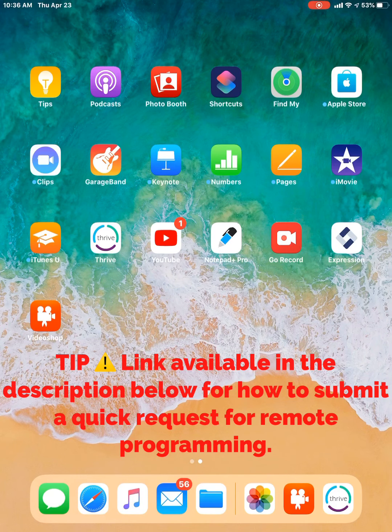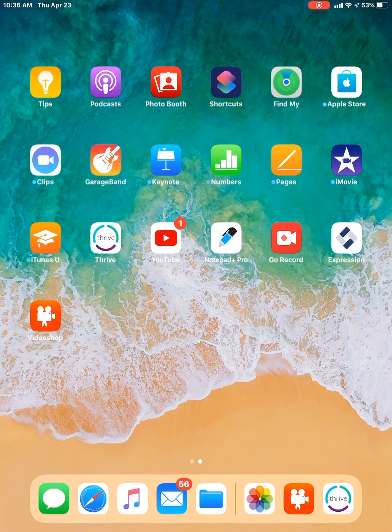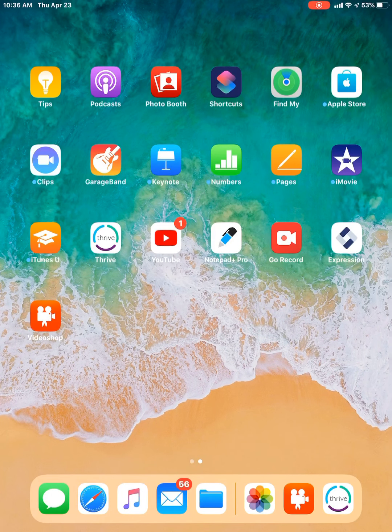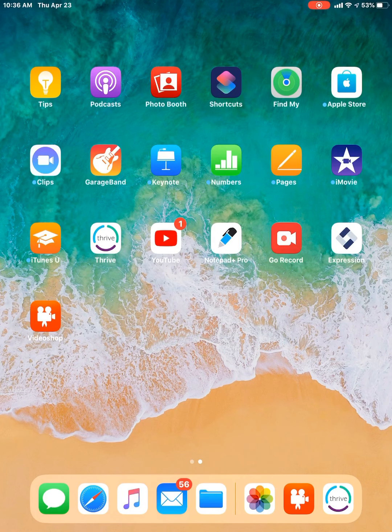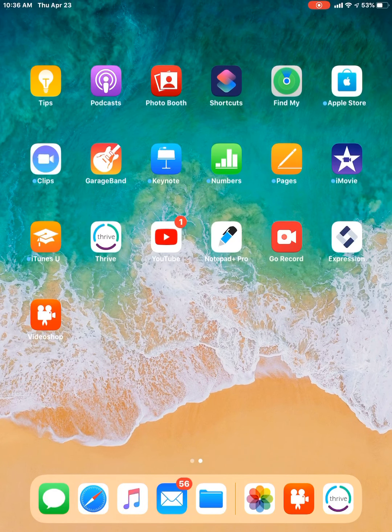But this is more in depth, like if your hearing aid suddenly quits working, it's dead, it's not doing anything. Running a diagnostic can help you to check the receiver and the circuitry and the microphone of the hearing aid. So it's just another thing that you can do without having to reach out to your hearing care professional. So I'm going to walk through that.